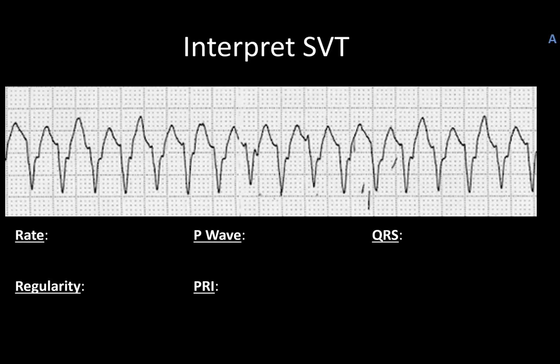All right, final bit to wrap up this section. Looking at this right off the bat, I'm sure a handful of you just feel like, oh, that's got to be V-tach. That's that. Well, actually, it's pretty common that SVT and V-tach can be argued against one another, because SVT can look that way in some cases, and that's my whole point. We're going to walk through that today.